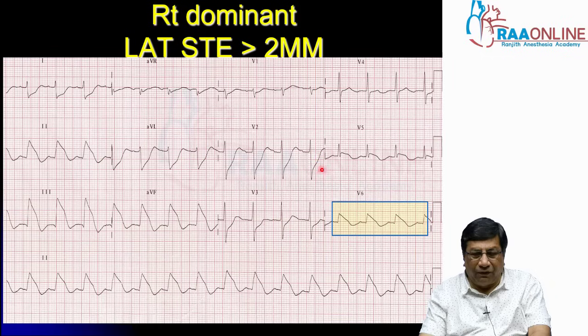So it is going to be a very high risk inferior wall infarction because the areas involved are inferior wall, lateral wall, posterior wall and also the right ventricle. So this immediately gives you, although it is an inferior wall infarction, a very high risk one, because multiple areas are involved.